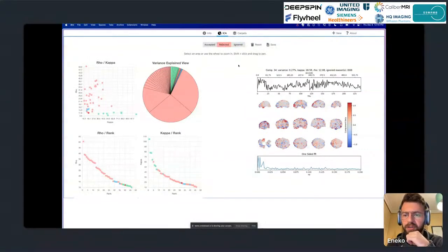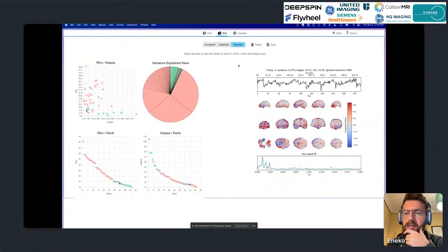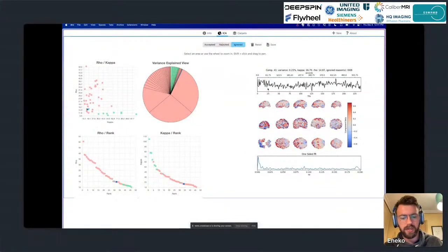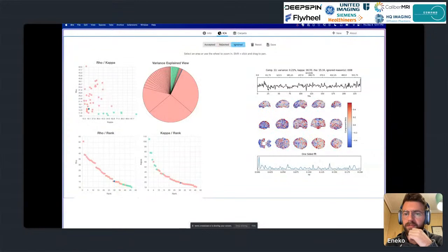Again, funny time series, and there's no specific frame activity pattern or regions coming out that make much sense. Same here, you can see some stripy pattern, and these huge drops in signal are kind of funny. I am also going to reject this one. This one's really high frequency, so I'm going to reject it, and this one too. And I think those should be all of the blue ones.